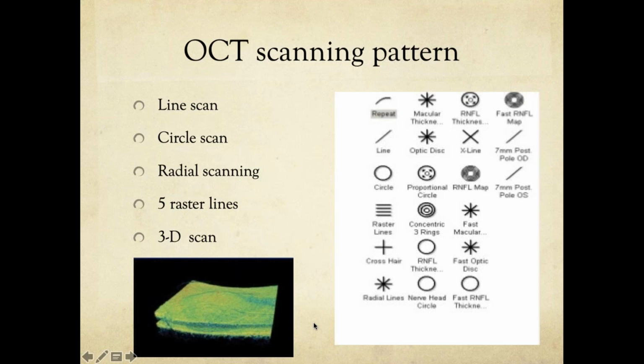Now, the other thing that can happen is, for example, a patient who has a trauma to the eye and you have a central macular thickness of 245, and the vision is decreasing. It was 6/12 at presentation. At 1 month, it is 6/24.